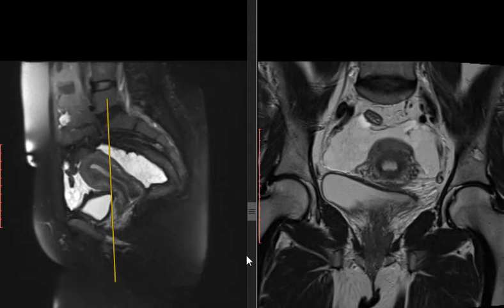They are often labeled as lymphatic malformation. By all means, anyone would report it as a lymphangioma or lymphatic malformation or things like that. You are totally correct, on the right side to write that, and no one can blame anyone for saying anything else. Okay, so it's a very rare case that I would like to share with you.